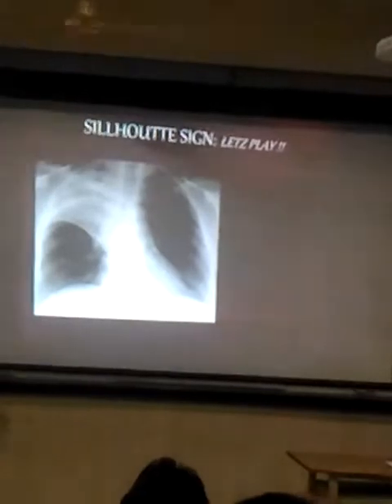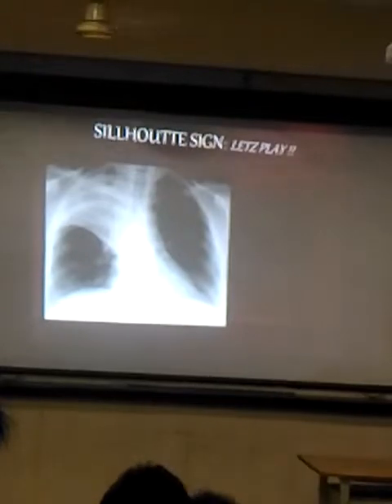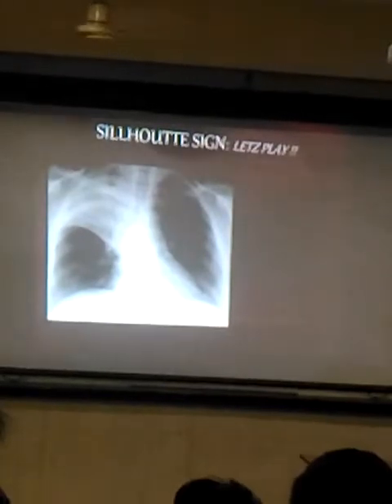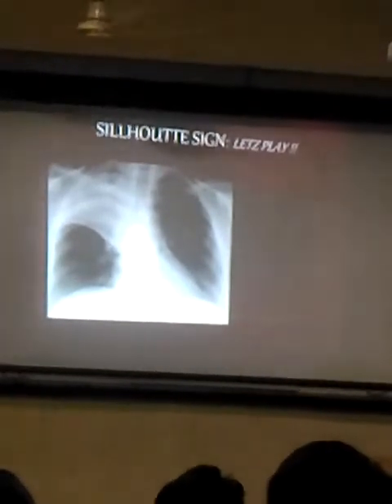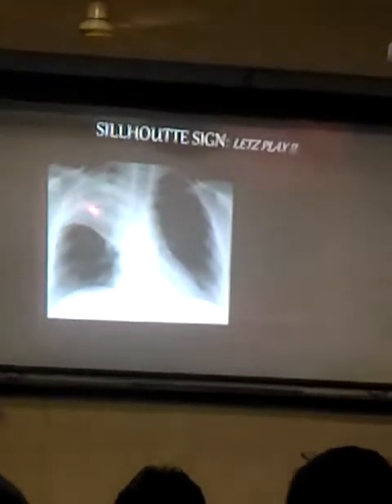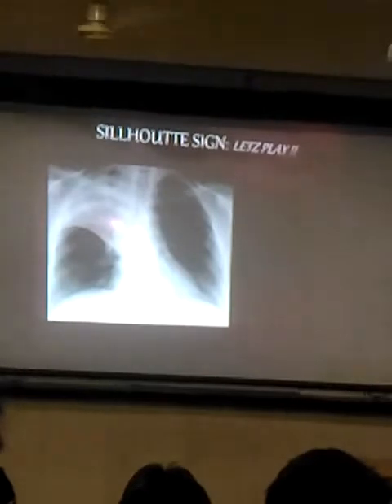Okay? Fine. There is another finding on this radiograph. I want you to stare inside the opaque part of this particular radiograph. Look inside the right upper lobe opacity. Can you see something inside it? What do you see? If you watch very closely, I'll help you with that. Can you see some linear, lucent or black lines here? If you watch very closely, you can see that there is a black line here which is branching into two parts, two lines. Again, there is a line here which is branching into two black lines here.